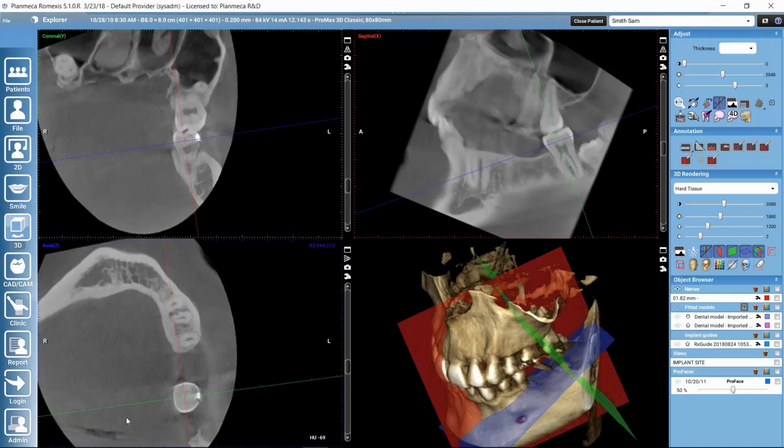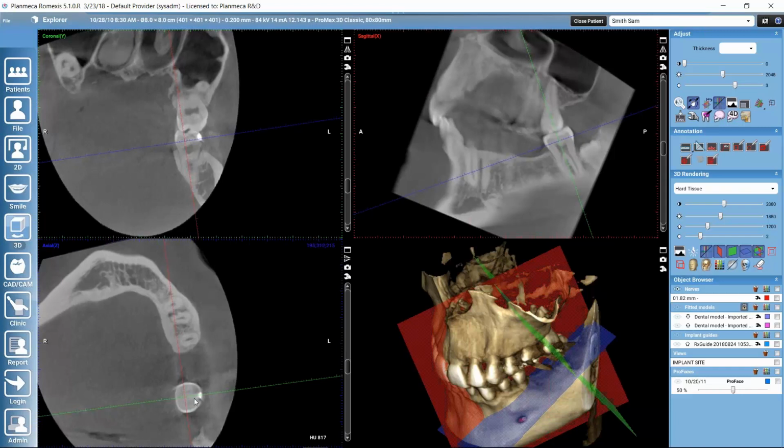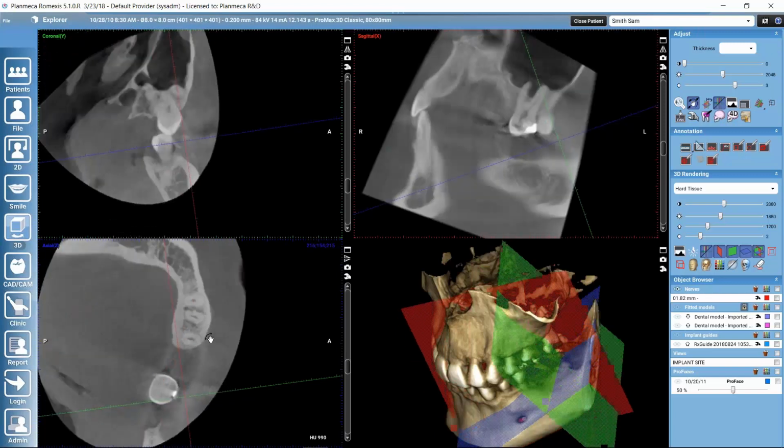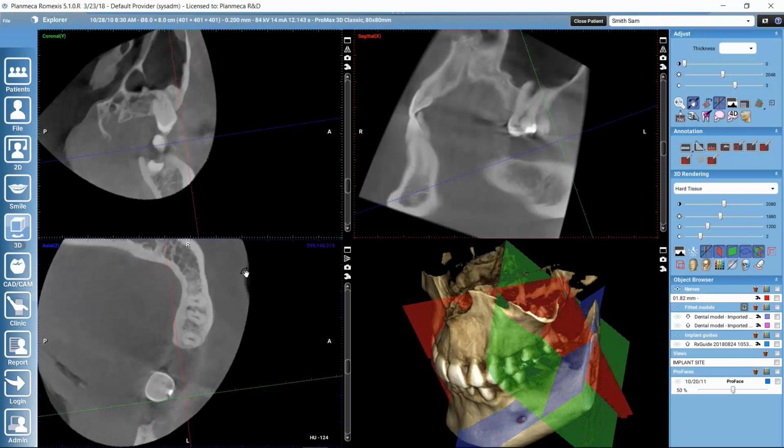the focus. And now, for example, if we would like to move the volume around this cross-section here, and if we activate this Move Rotate Volume again and rotate with the right mouse button, we see that it doesn't get rotated according to this point where the cross-sectional planes meet, but instead it gets rotated according to the center point of the view.